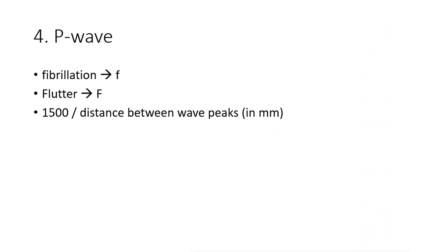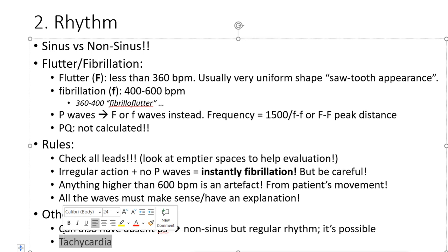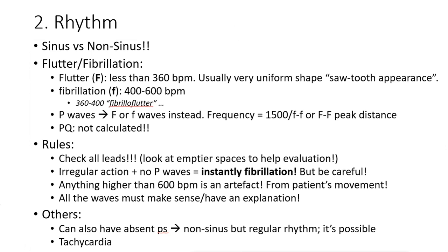Another point, of course, I forgot to highlight. One of the last points on this idea of rhythm is that sometimes the rhythm can look quite like, oh no, this looks like there's fibrillation, because I see a lot of these small waves. So I'm like, oh snap, that might be fibrillation, or it might at least be flutter. And it turns out that it's neither of them.